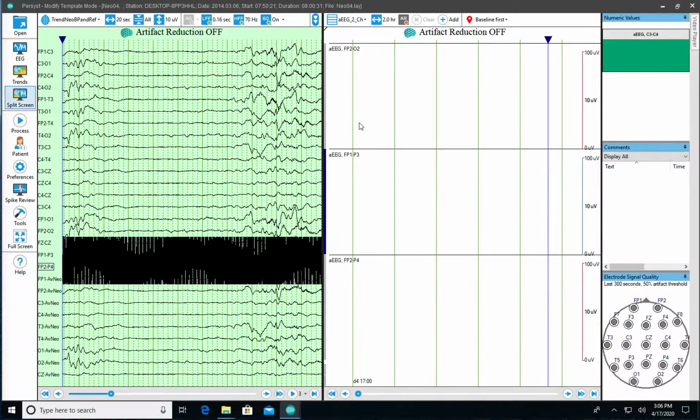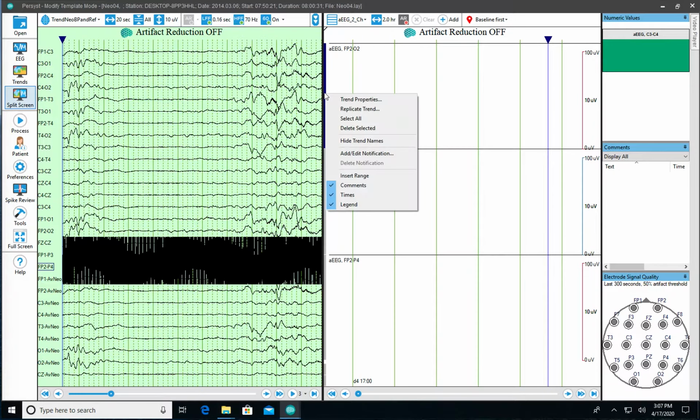Typical convention is left over right, but you can have any convention you want. In some places, right is blue and left is red. Again, you can use any color scheme you want. There's no right or wrong. It's just what is the most understandable, the most immediately intuitive. That's what's important. So go ahead and delete this one because we're not going to use it in this panel.